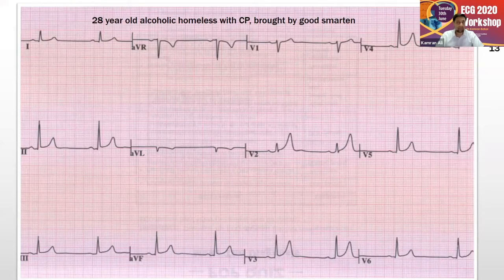All right. One more ECG. This is a 28-year-old alcoholic, homeless man with chest pain, brought in by someone who was passing by on the road and saw him unconscious, and brought him to the emergency room. So this is the ECG. What's going on? Is this guy having a heart attack?